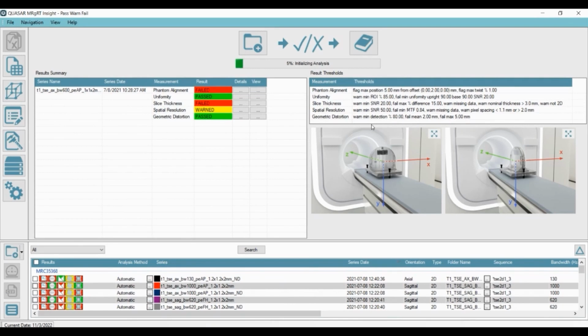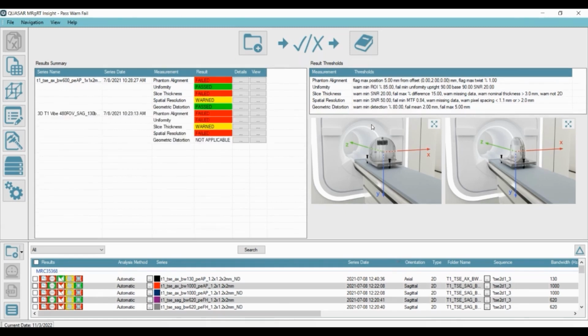Once it is pulled in, it is configured to be processed automatically such that your system's images are analyzed through a fully automated process. However, you can also simply select the series from the data browser and then click this process button right here in order to trigger the analyses. And so when that data is fully processed, it's going to be populated directly into this different view here.